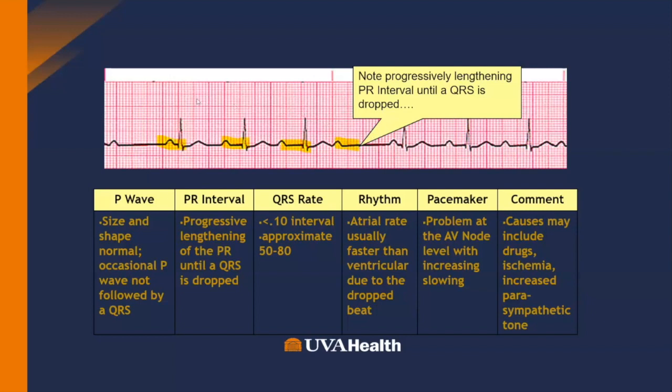So that's one of the defining characteristics of second degree block, both second degree type 1 and second degree type 2. And that's where you have these beat sets, because you have 3 R waves here together, you have 3 R waves here together. So you have these grouped beat sets. By physiology, second degree block is always irregular. But it is, in this case, predictably irregular in this particular example.